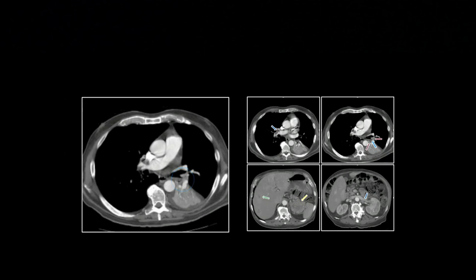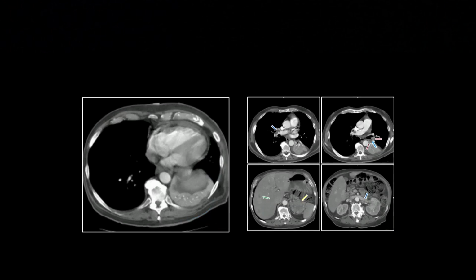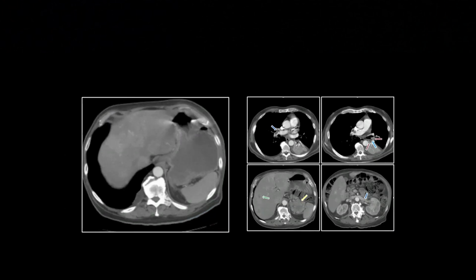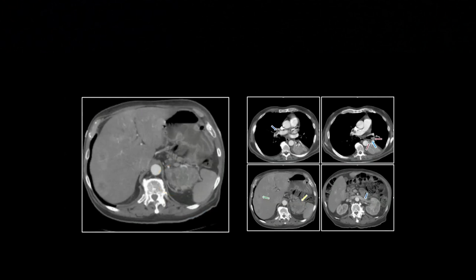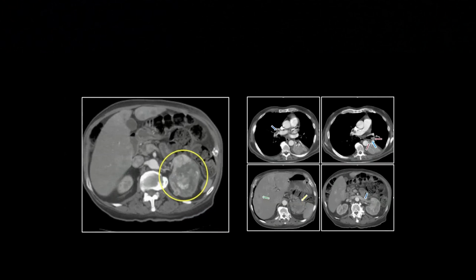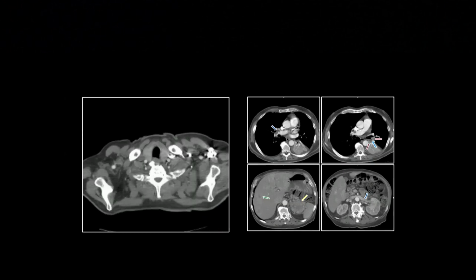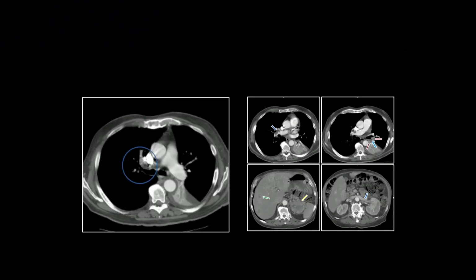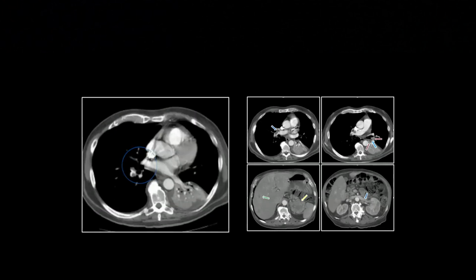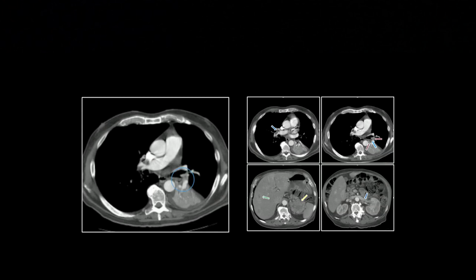And let's look at that left lower lobe bronchus that's squeezed there by the adenopathy. There's a little bit of air bronchogram there, but that's not the kind of thing that should dissuade you. There almost always is some residual. Complete absence of air bronchograms in my book is pretty rare. So airless lung is what I prefer to call that, rather than a lack of air bronchograms, because that's really not the definitive sign. Clearly, that is an obstructed bronchus in spite of the fact that there's a little gas still.